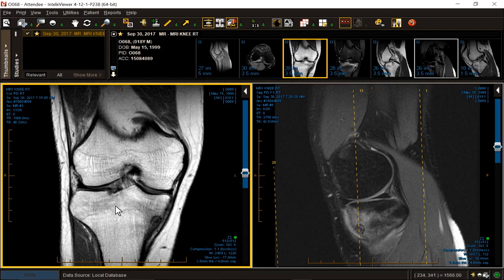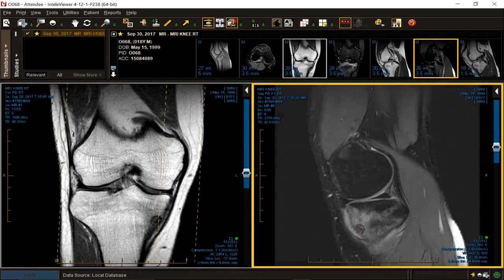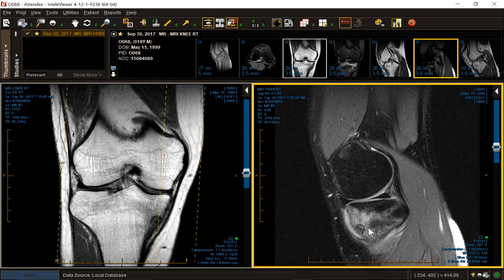So we either are dealing with edema related to this lesion primarily, or edema related to trauma from altered mechanics of weight bearing from pain from this lesion. And it's hard to say which is which. But I would posit to you this, that most of the edema on the medial side is related to this lesion. Look at it in the sagittal. It's the eye of the storm. It's Cyclone Tracy. It's Darwin without the alcohol. And the edema is circumscribing in a cyclonic fashion right around our nidus.